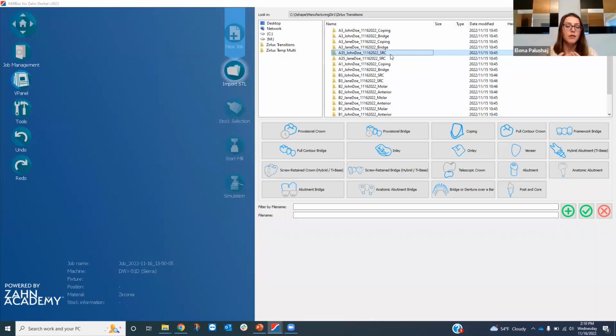Well, if you have a manufacturer directory that's probably been there for years, that you've been using the CAD software, you have a long list that you have to scroll through to find your cases. One, it slows down the system when it's trying to open it up here, because there's a lot more cases that it needs to load versus only those that need to be loaded.